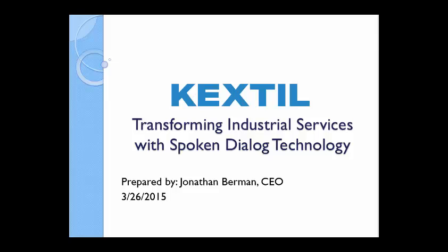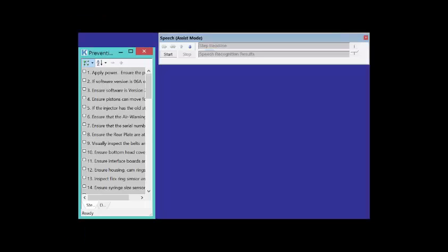Again, you can picture your field technician wearing a headset connected to your applications running on whatever device that you're running. This is a generic GUI. On the left-hand side of the screen, you can see the steps. This is a preventative maintenance procedure for a piece of medical equipment. So we'll interact with some of these during our quick demonstration.